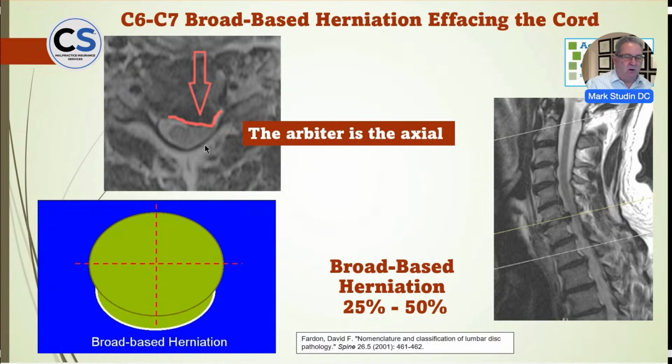Do they have serious motor loss, areflexia? You have to know how long it's been there. Are we looking at cord edema? It looks like there is a little bit of cord edema going on here because the cord's swollen. The next step from that is myelomalacia. The cord's going to start to die. So I want to get this decompressed quickly. This person might not have the liberty or the leeway of waiting so much time. That delay can cause permanent spinal cord damage, and we're talking for the rest of their lives.